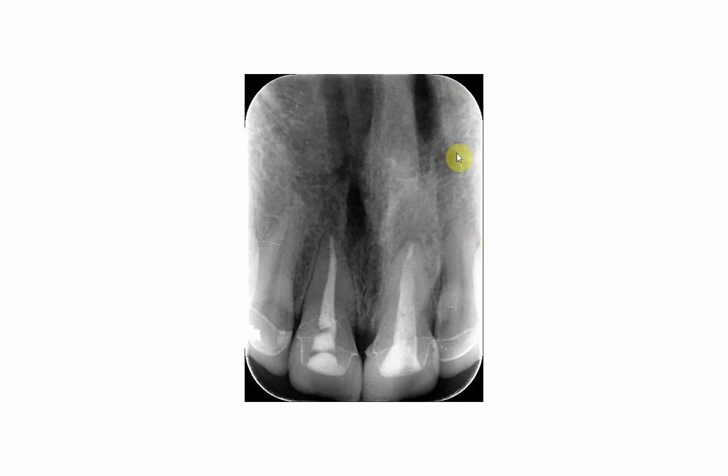But again you will see most of the premaxilla appearing because the X-ray has come through the premaxilla.